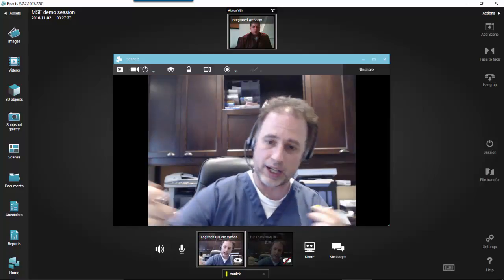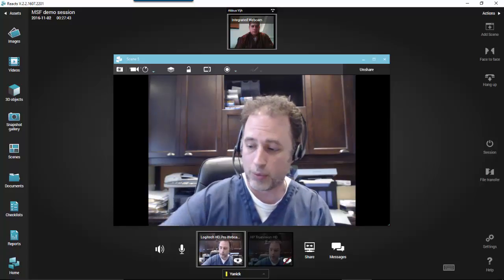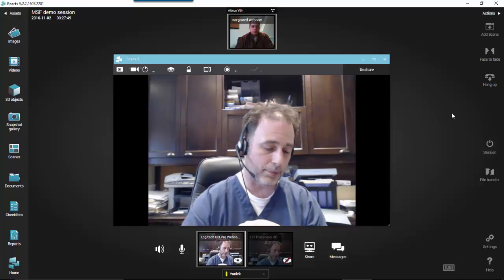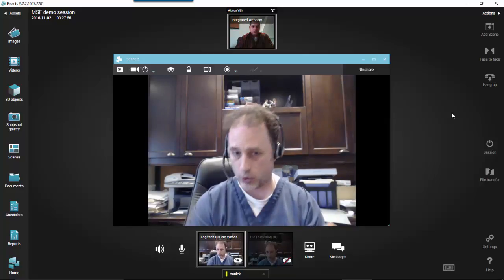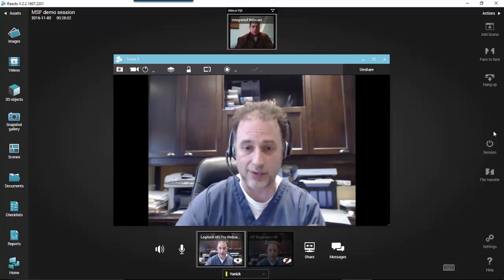And the minute you connect it in Reacts, it's recognized as a webcam, and you can diffuse it to other people remotely. So it shows you the wide array of applications of Reacts, both asynchronously and synchronously. And it shows you can use it for secure communication, for telehealth purposes, or for remote education, training, and live supervision.